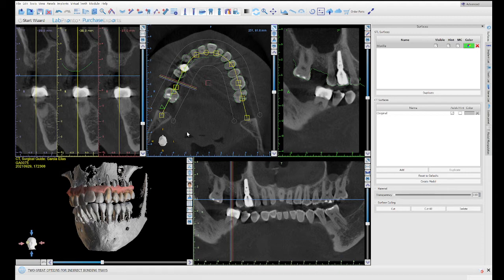And you're going to select first the size. I'm going to put a medium one, and it's tooth number 3. And I'm going to use the library. I don't think it gave me the option of the library here. It used to give you options of the library. Yeah, right here on the top. So you see you have all these libraries. I'm going to just keep it as it is right now. So I'm going to go ahead and click OK.